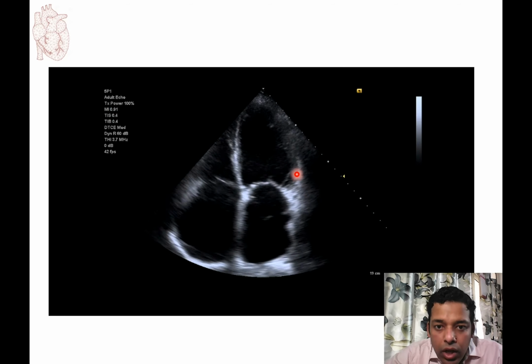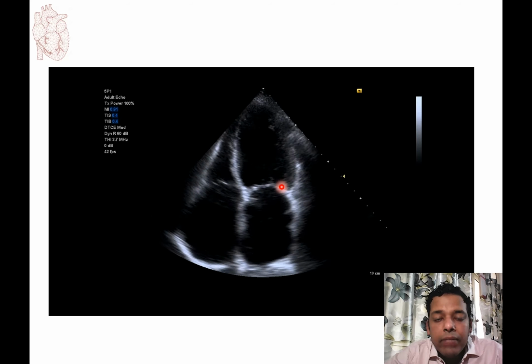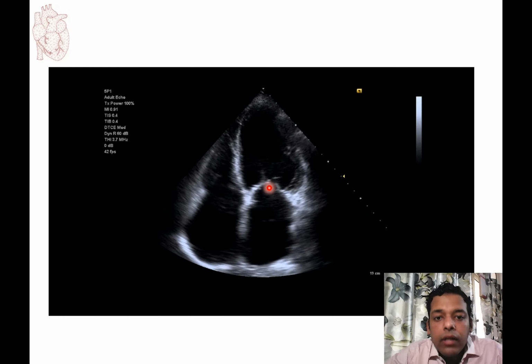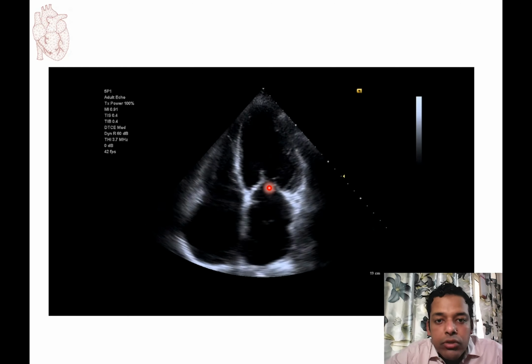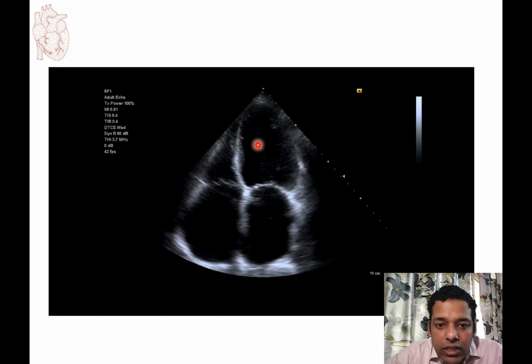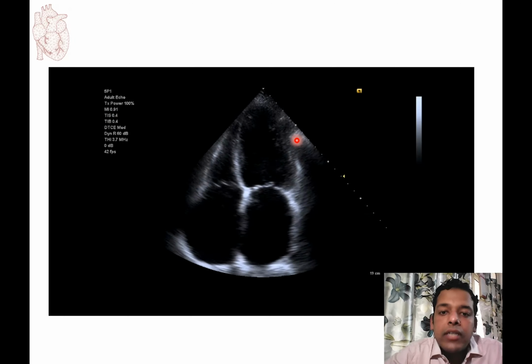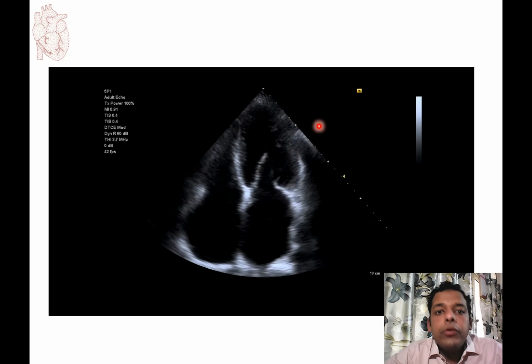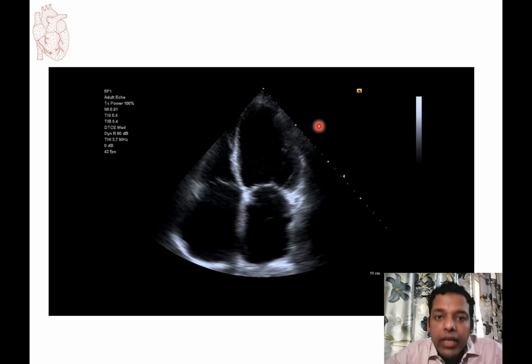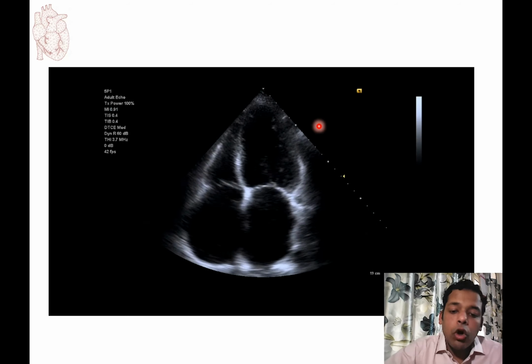The decrease in the long axis dimension would mean the longitudinal contractility, and the movement with respect to the short axis would mean the radial contractility. You need to see whether the walls are pulling in evenly and whether they are pulling in too much or not enough.